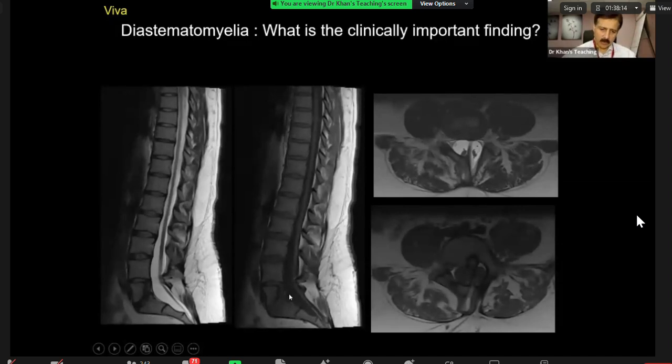If you look carefully, look here. This is the distalmost portion of the filum, and it has got a high signal here. This high signal is beautifully seen on an axial T1 weighted sequence. This is a lipoma. A lipoma or a fibrolipoma here is also considered an incidental finding. But in this particular case, what is happening is that it is tethering the cord.